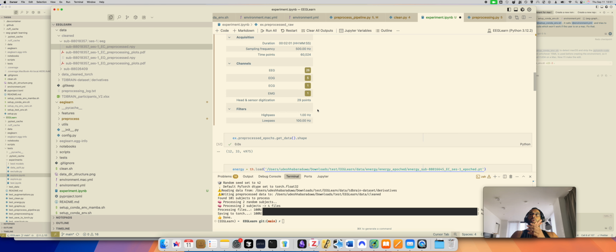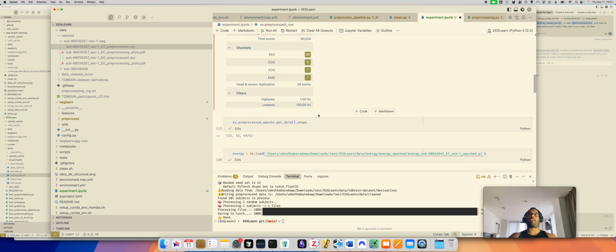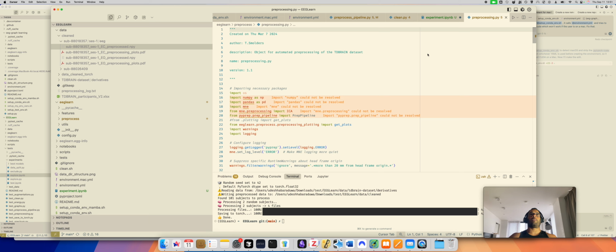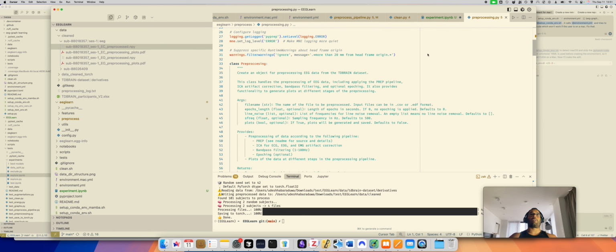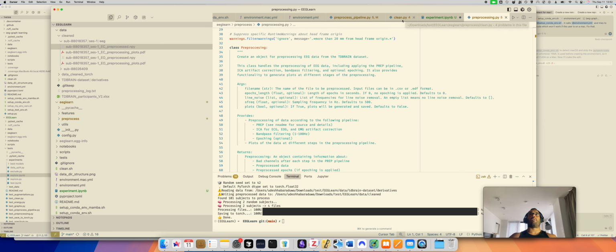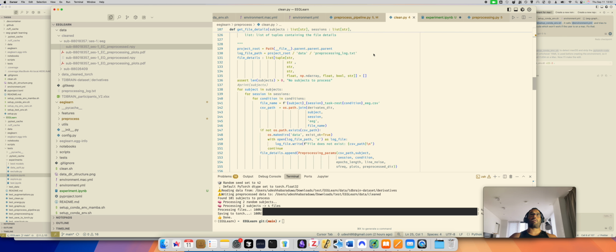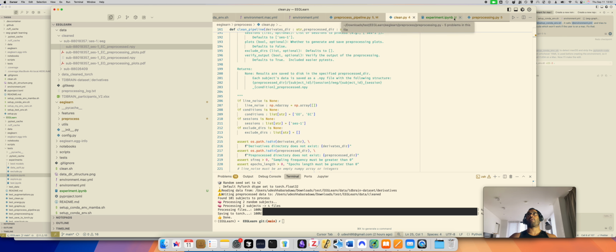And if you want to really understand step by step what's happening, I recommend you go to the code and look at the doc strings of each of the files, and I've written everything out very clearly there, so you can see the doc strings are quite informative here, for example. And even in here, I've written everything out quite lengthy. You can, yeah, check everything.